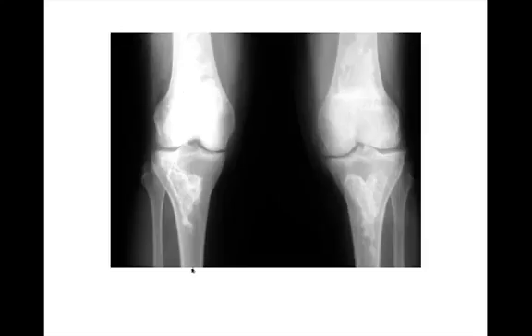Okay, two views of the knee here. This is not a bone tumor in this case, but something that can mimic a bone tumor. Here you have these sclerotic serpentine lines in the proximal tibias and distal femurs. Sorry, this is artifactual here, kind of blown out. But these were bone infarcts. Bone infarcts can occasionally mimic enchondroma, but if you see this kind of classic serpentine morphology, you can just really say these are bone infarcts and be done. This one is kind of a Valentine's Day infarct, a little heart shape there.